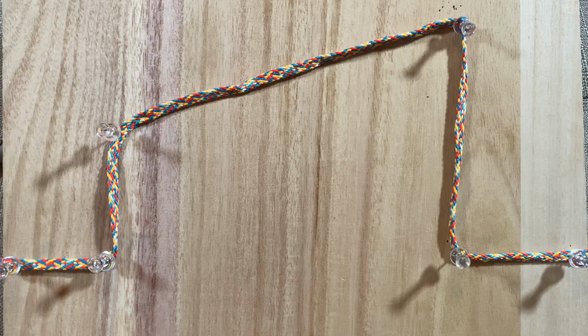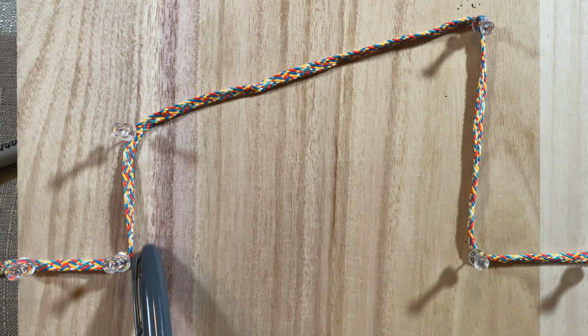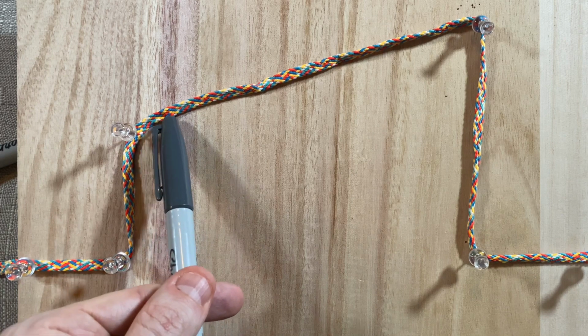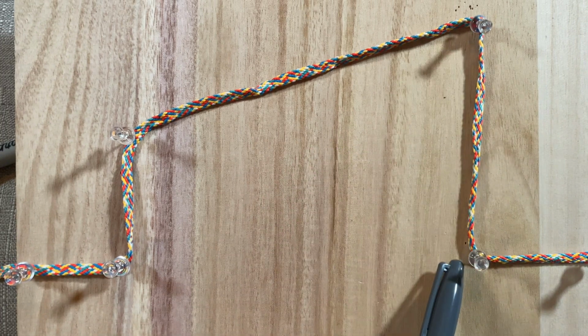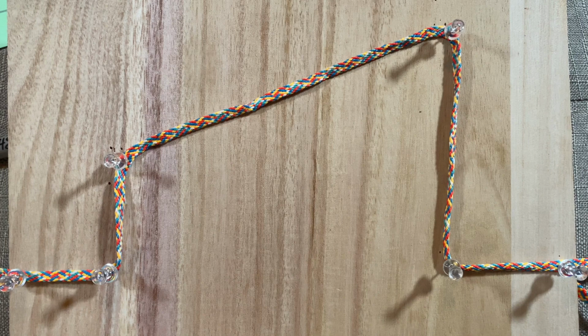The pressure waveform looks like this in a patient in volume control with a decelerating ramp when they're making no effort. The baseline now on this screen is down towards the bottom off the screen. So right here, this level of pressure is at the level of PEEP. As inspiration begins, we see the pressure start to rise here, and then because we're in a decelerating ramp, the pressure rises more slowly over this period of time until the inspiration ends and we return to baseline again and we enter exhalation.